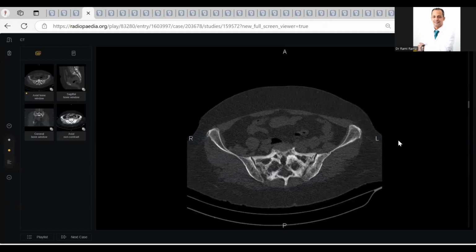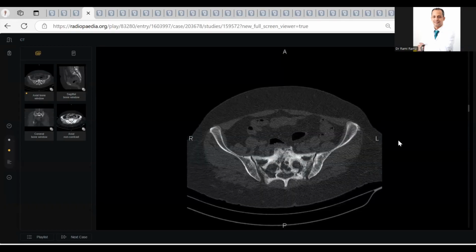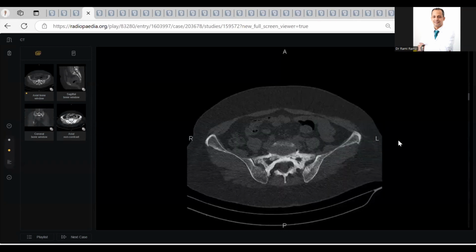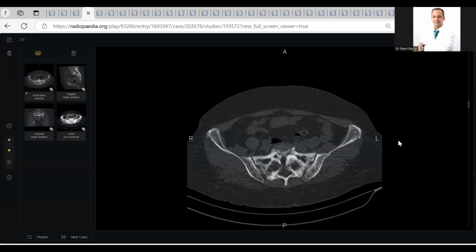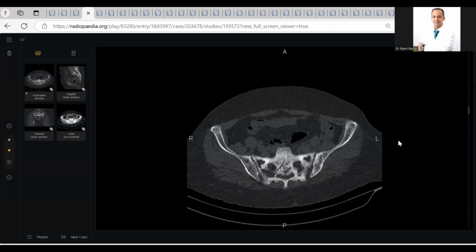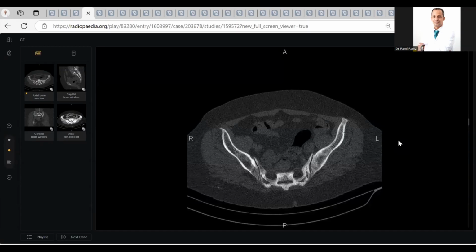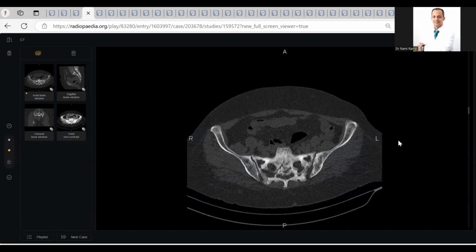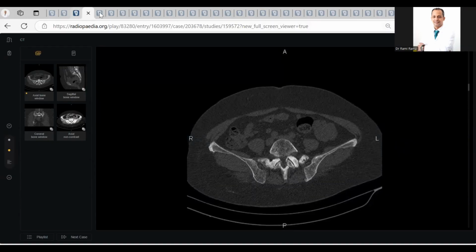Sclerosis of the sacrum in old age. What's your differential diagnosis? Is this aggressive or non-aggressive? Sir, it is non-aggressive areas of sclerosis and lysis. So I'm thinking another possibility is Paget's disease in a mixed lytic and sclerotic phase. There is no significant destruction of the sacrum or soft tissue component. There are several areas of lysis and coarse trabeculations involving the sacrum. The joint is spared.